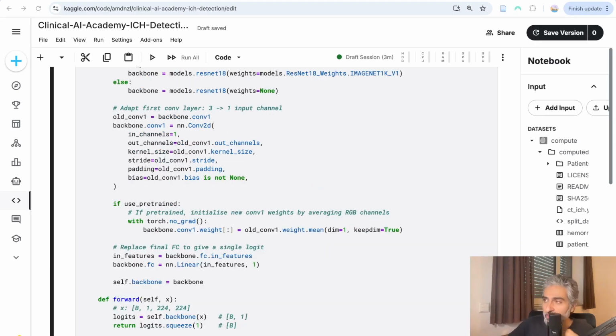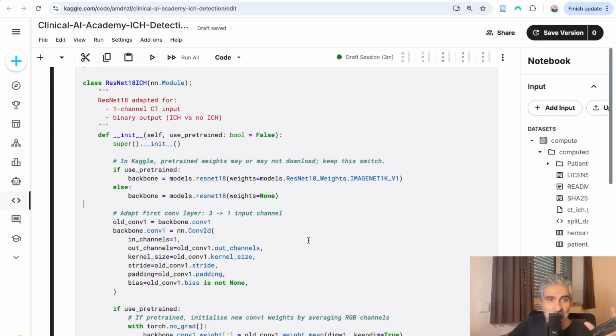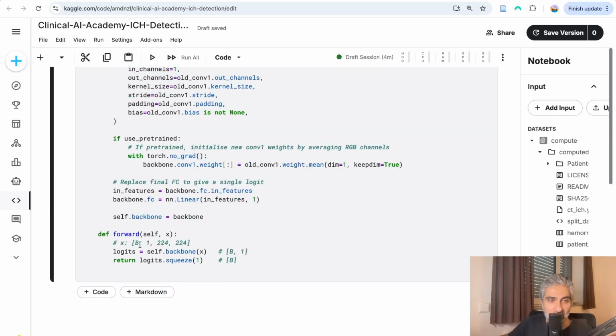It was trained on ImageNet, so we can benefit from what is called transfer learning. You train a neural network on seeing things, and then you have the weights, so it is more used to images, for example, and then you could use it for your task. But for now, we're just going to use this residual blocks ResNet architecture and define the forward pass.